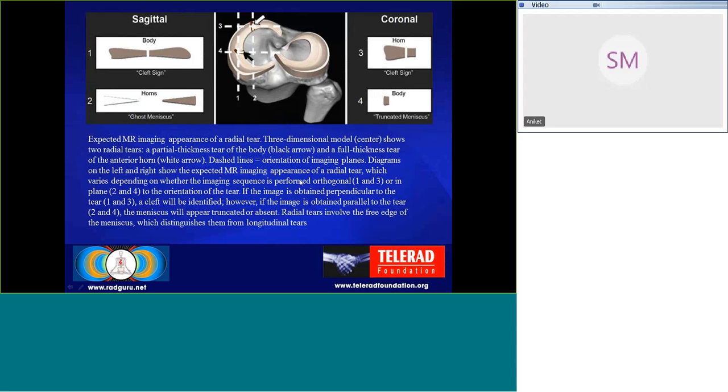So here, this is how a classical radial tear appears on sagittal images. We can see a cleft in the body of the meniscus, and similarly on the coronal images we can see a cleft, or sometimes on the coronal images we can see a truncated appearance, or in sagittals we can see a ghost meniscus sign where a radial tear is there.